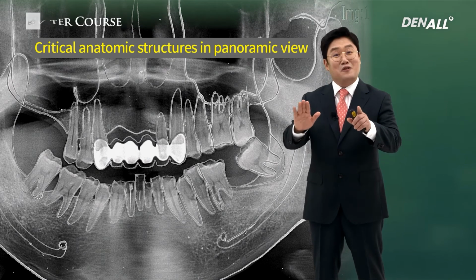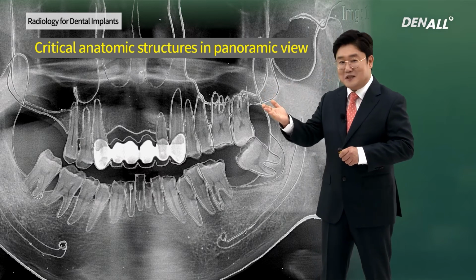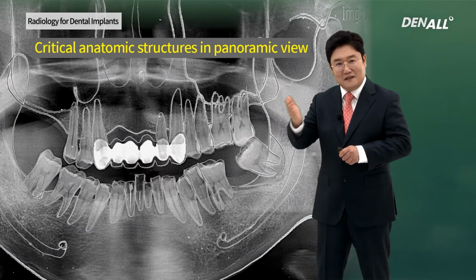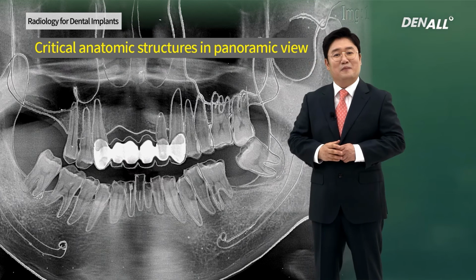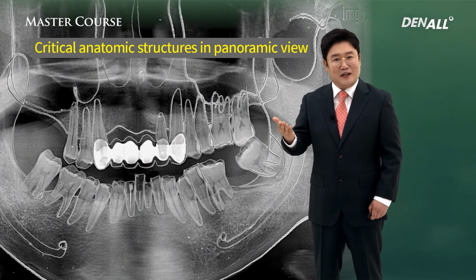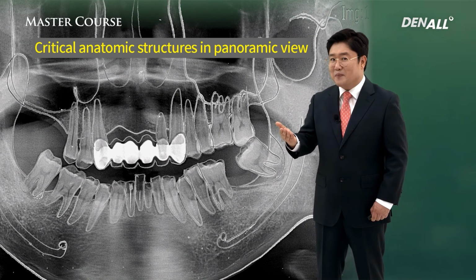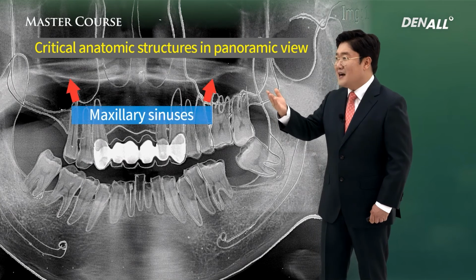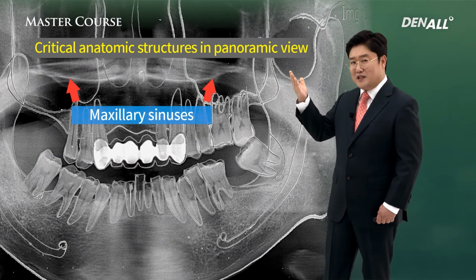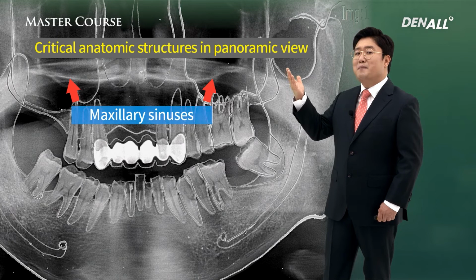On the panoramic view, transparent paper was laid with a sharp pencil. The pictures were drawn. What was it called? Tracing. Through the tracing on the panorama pictures, we identify the important things. First, maxillary sinuses, the location, borders, and the condition of the sinuses were identified.